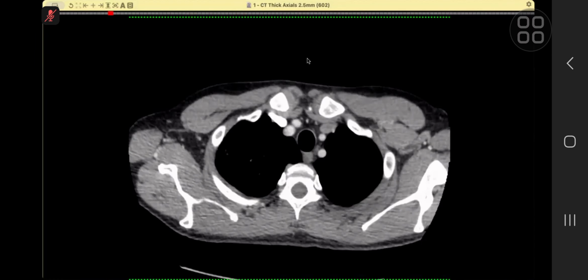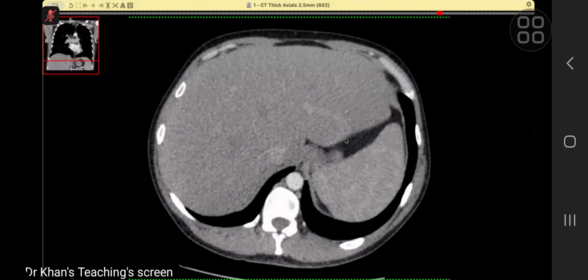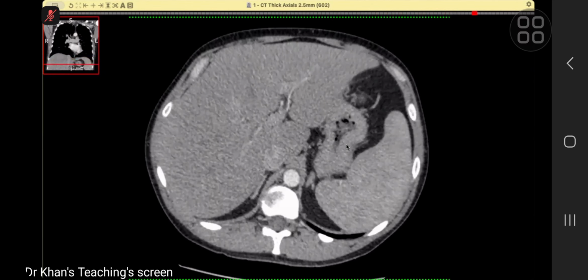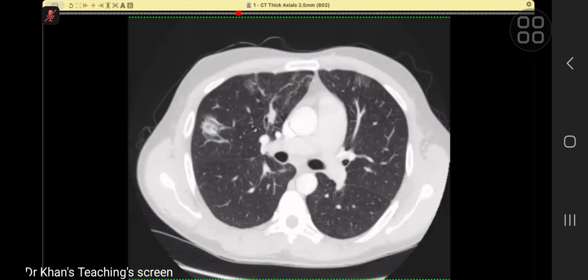Yes, I have been presented with chest CT scan axial images with IV contrast for a drug user. I will take a general look before I comment on my findings. I noticed that there are lung changes, most in the right middle lung lobe, which looks like a cavitary lesion.